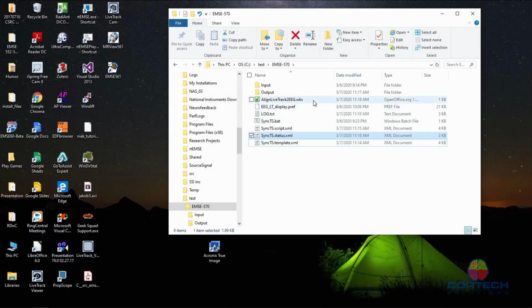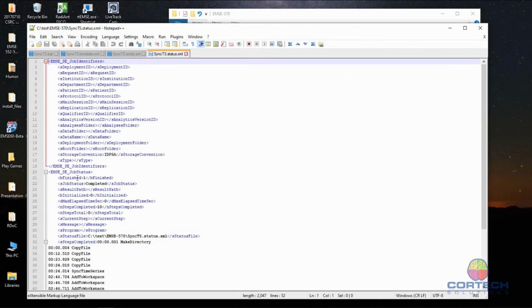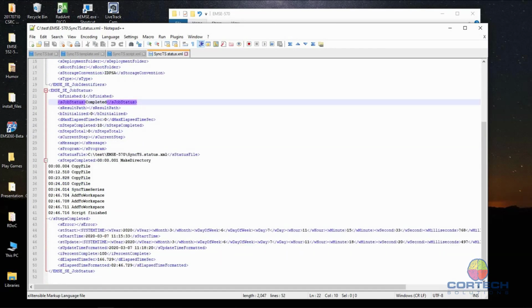We now have an EMSE workspace where we can view the results. And if we look at the status now, it says it finished, completed. That means it was successful. And it took 2 minutes and 46 seconds. Okay. All right.